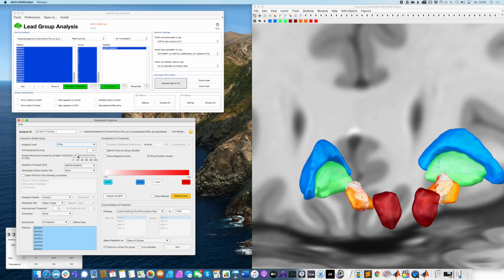And the reason for that is you can imagine some voxels in the fringe, in the periphery of the field, that are only covered by a single VTA or two VTAs, right? And maybe by mistake, this VTA is an outlier that has a very strong improvement, but it's not really true. So we cannot really draw statistical significance in that region. But if we would consider it, it would still have a larger value. Now we have to define basically, how many VTAs need to cover a certain voxel to be considered.